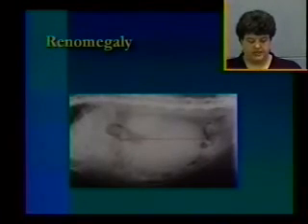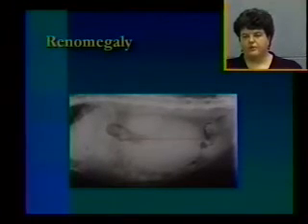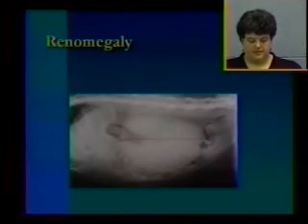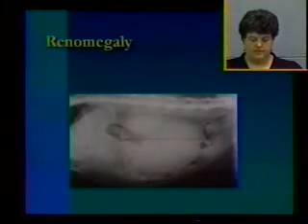This is a lateral projection of a cat abdomen. You can see one normal kidney sitting up underneath the body of L3, and then the very abnormal kidney sitting ventral to it. You can tell that this mass is arising from the retroperitoneal space, because it's ventrally displacing the small intestines. If it was on the VD, you could also see this as well, that they were being spread to either side. The next step in this case would be to ultrasound this animal to help you determine what specific abnormality is going on.